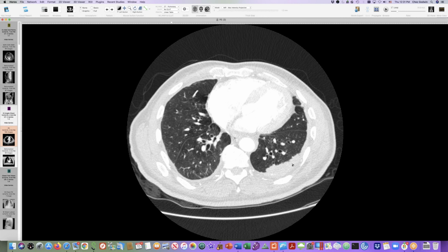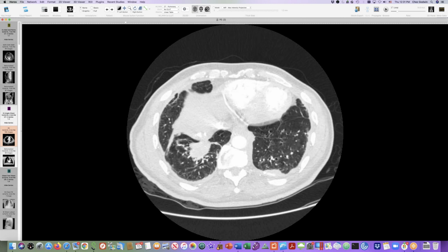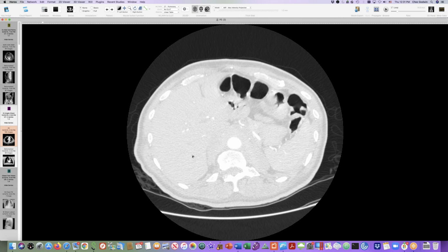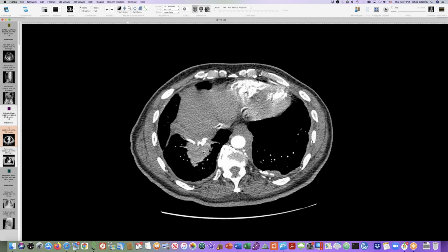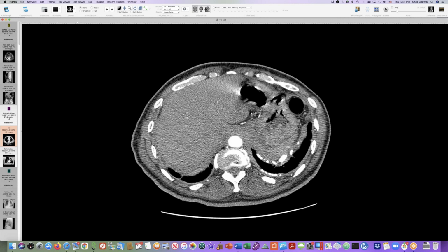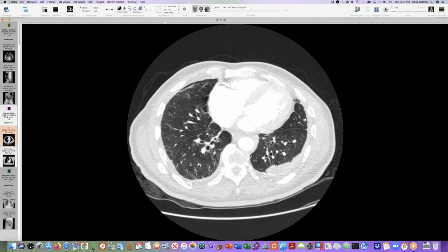And you can see that this is definitely a lung condition. It's not pleural because it's got all these air bronchograms in it. So this is a rind of lung fibrosis or lung scarring here, relatively discrete. And given that most conditions formerly known as idiopathic retroperitoneal fibrosis are really caused by IgG4 disease, this is probably a bizarre manifestation of IgG4 disease with this peripheral lung scarring.